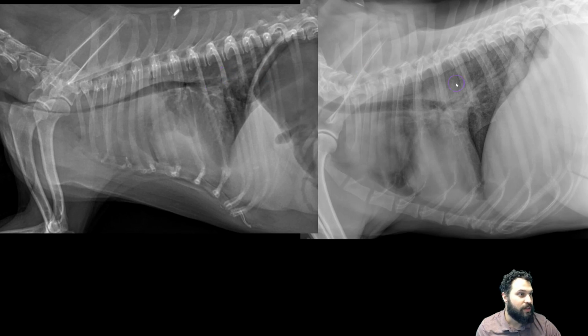And if we compare the lungs in these two dogs, we can also see that there's that unstructured interstitial change compatible with the pulmonary lymphoma, which we're not seeing in a dog with something like thymoma. So those are the main findings. I really hope this has been helpful and helps you the next time you're encountering a cranial mediastinal mass in your practice.